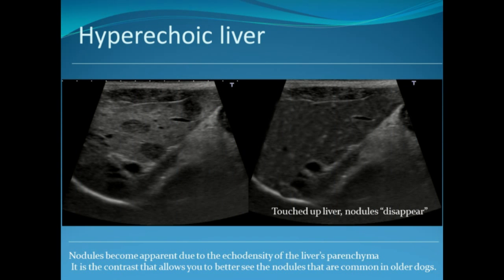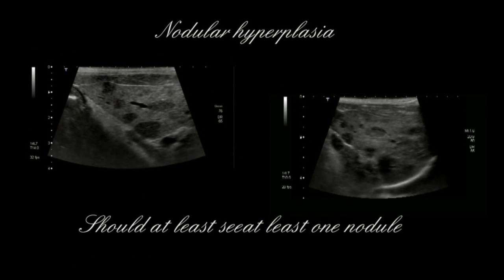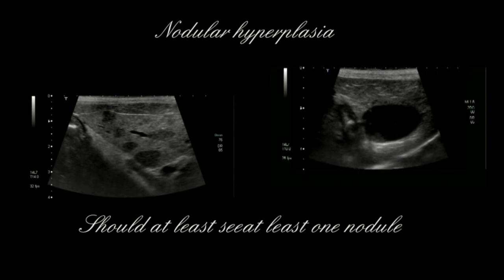nodular hyperplasia. And nodular hyperplasia is not an abnormal thing in dogs. It's a common finding in older dogs. What's abnormal is to be able to see them well. So I've altered the image on the right to make it look like there's no nodular hyperplasia, but as the liver becomes more and more hyperechoic with Cushing's disease, it creates contrast to allow you to see the nodules. So if we look at these images here, we can see a liver that's riddled with nodules. But once again, you only see them because Cushing's disease has created a hyperechoic state to the liver.